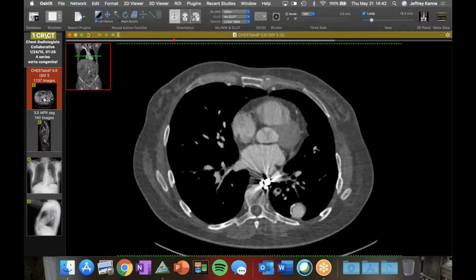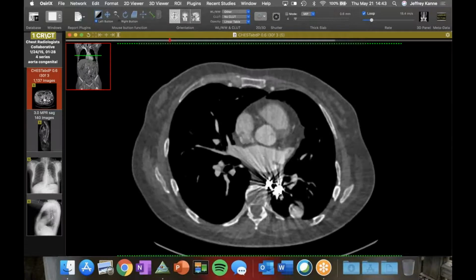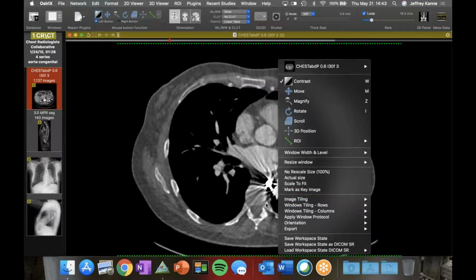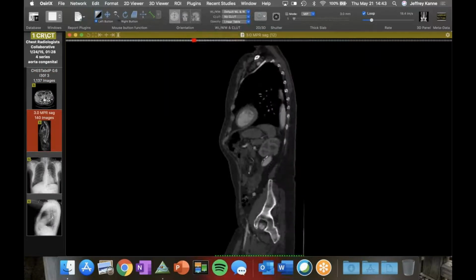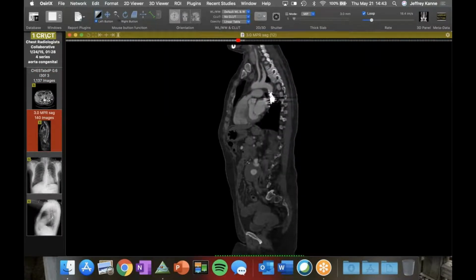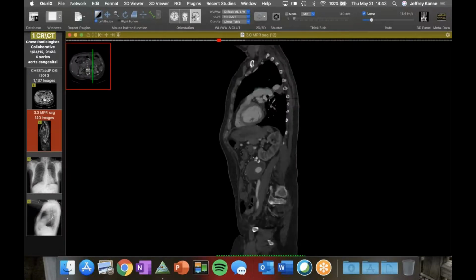You can see there's already embolization down in this area too. There's big coils down there. So maybe at some point there was a communication, but I haven't seen too many of these grafts. I don't know if anyone else has. It's not a common treatment for coarct, but it just made for an interesting radiograph. And this is where they embolized the native aorta at that point. And then there's the aneurysm down there.